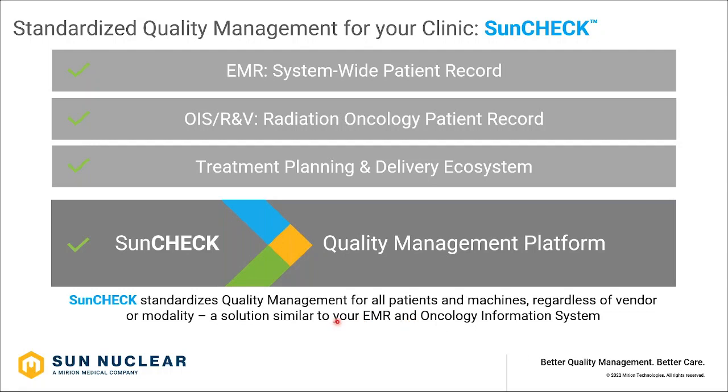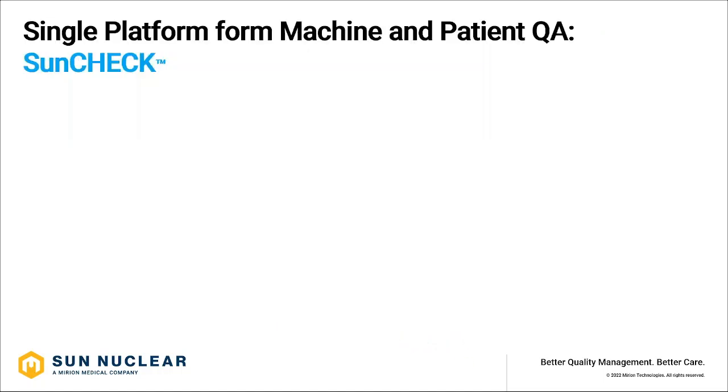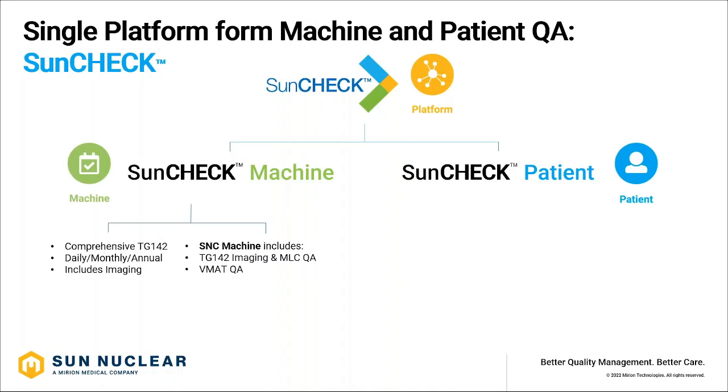SunCheck will help standardize quality management for all patients and machines, regardless of vendor or modality, a solution which would be very similar to what an electronic medical record system or an OIS is able to offer. Within the SunCheck platform, we have SunCheck Machine, which allows you to perform and record your daily, monthly, and annual QA results.